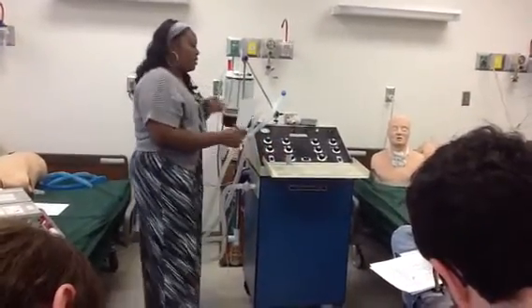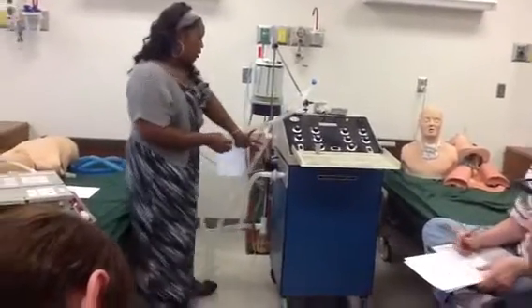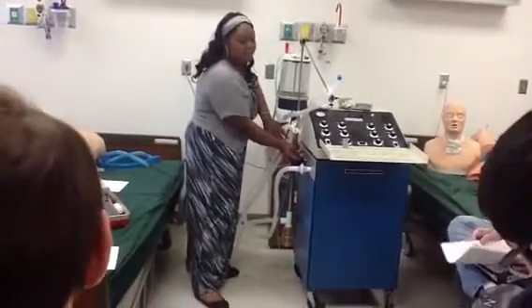And below that is M. That's your nebulizer. So this machine has the ability to give a nebulized treatment through the machine. And if you were to do that, it would connect here on the side. There's a little outlet that says nebulizer.